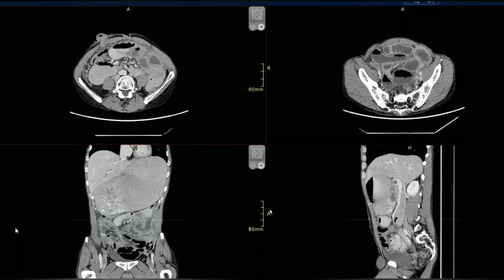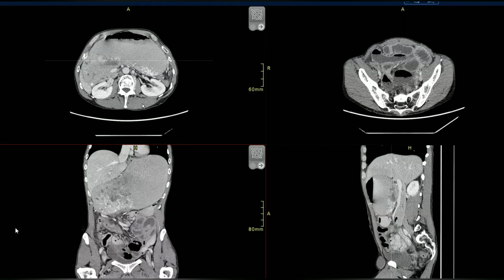So what is the main finding you see? Like something that is popping out at you when you're looking. Okay, look at this image, just focus here. So what do you see here? Ma'am, in the corners? Like this part, just this. So what do you see here? Ma'am, there's a heterogeneous density area noted in the... What is this?